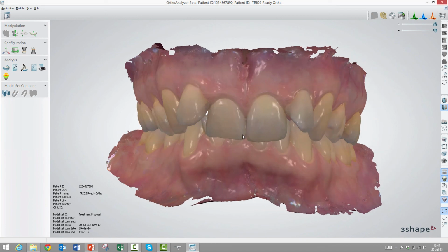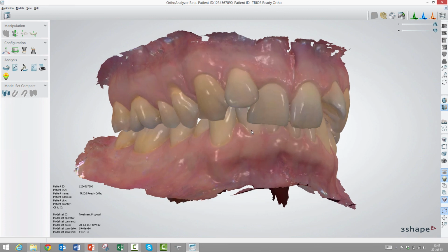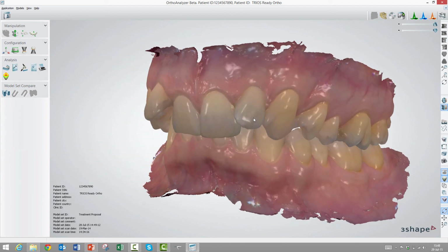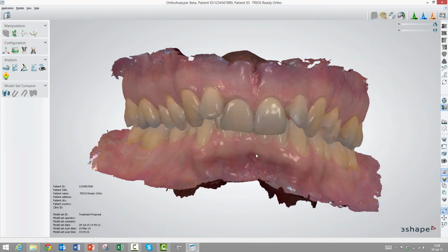It's almost like a freaky zoom level here. It adds a real 3D perspective to the model. There are certain cases when you want to show this to a patient where this is better, but I almost never use this feature. So for now, I'll take it off, and as you can see here, it returns to normal. And as we covered the last three when we talked about the mouse, I'm now through explaining what all these 25 tools are doing.